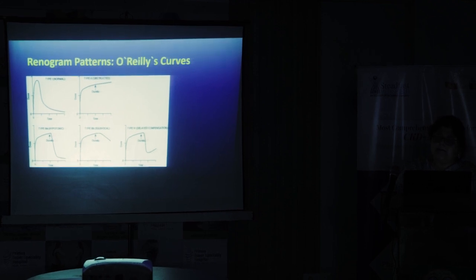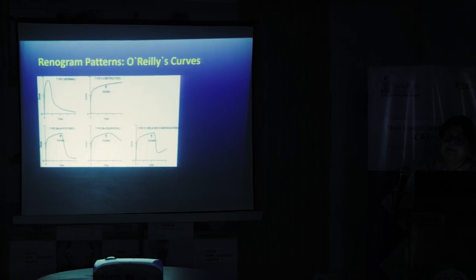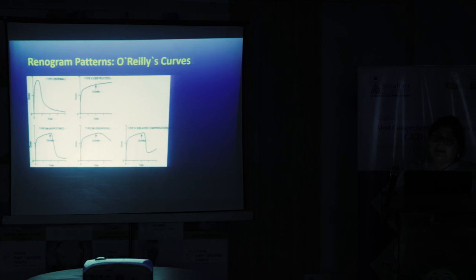Like I said, the uptake happens at 3 minutes, 3 to 5 minutes is the equilibrium phase, 5 to 8 minutes is the rapid excretion phase, and somewhere around 20 minutes of the study, you achieve about 50% of the max, or the T half max, and the tracer is excreted by the kidney by the end of the dynamic phase. Now this dynamic phase is usually about 30 minutes. Now this is an obstructed curve. This is a type 2 curve, right?